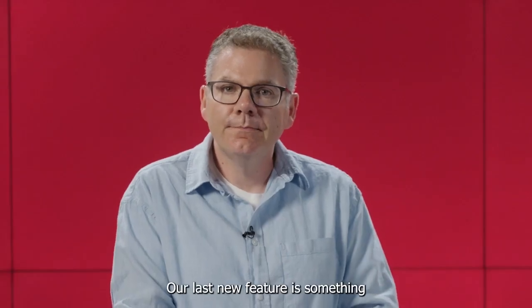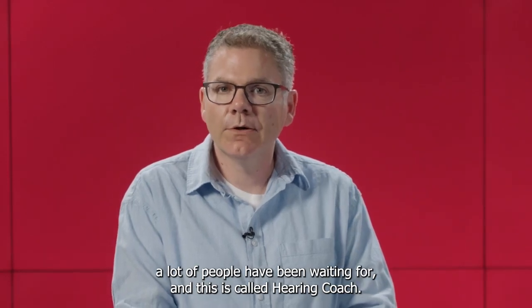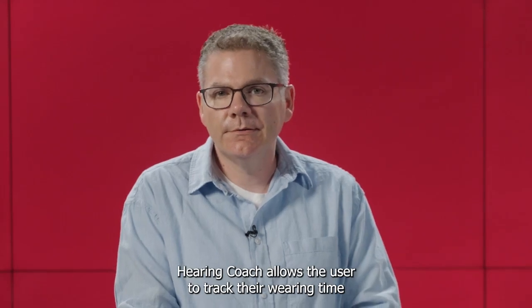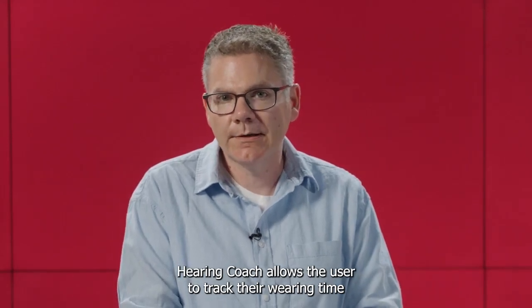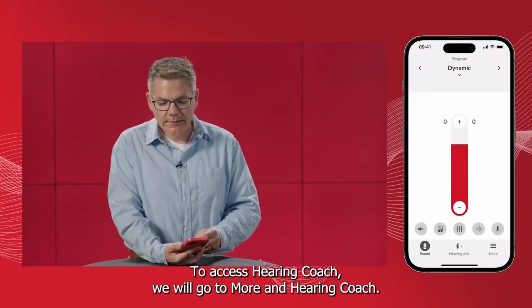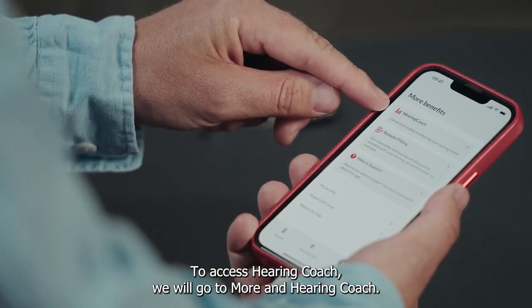Our last new feature is something a lot of people have been waiting for, and this is called Hearing Coach. Hearing Coach allows the user to track their wearing time and set goals for wearing time. To access Hearing Coach, we will go to More and Hearing Coach.